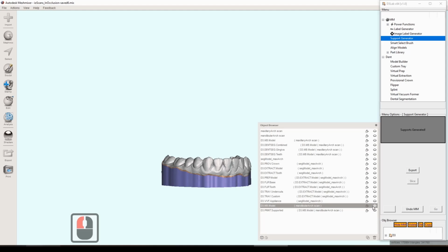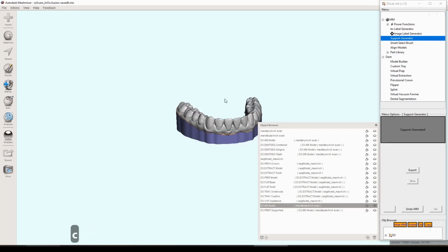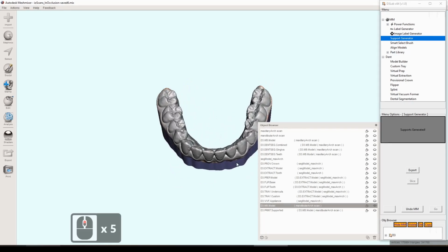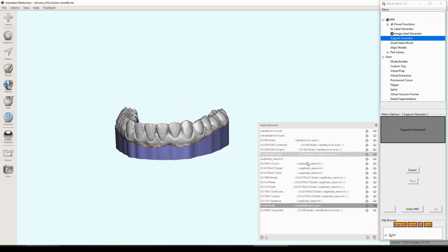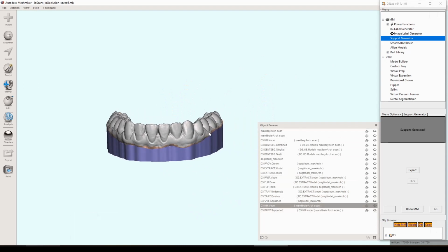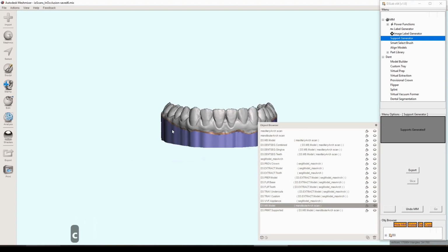It's worth explicitly pointing out that D3Lab is just a tool. It's a tool that is designed to be used by only trained professionals that can take responsibility for using that specific tool. That being said, the last several tools and features that we're looking at in this video are arguably equally as important as some of the other main tools that we've looked at in the prior videos.